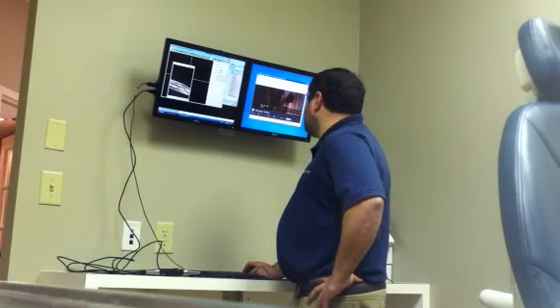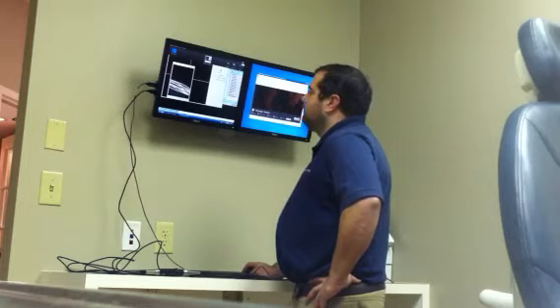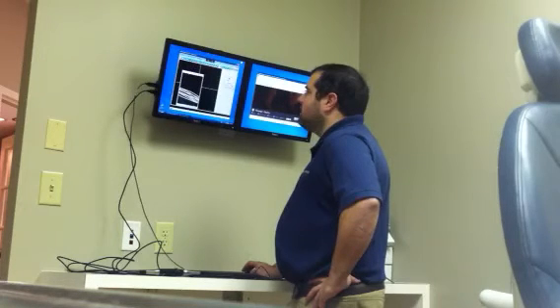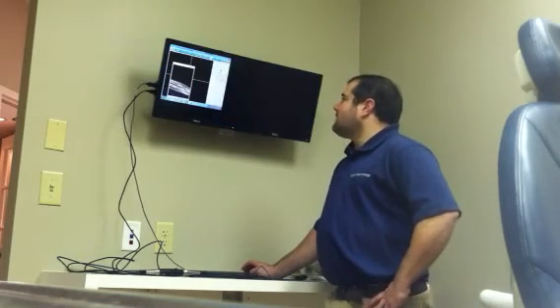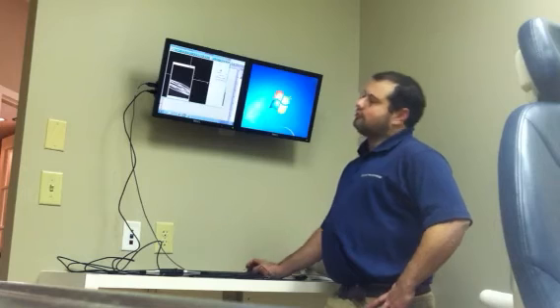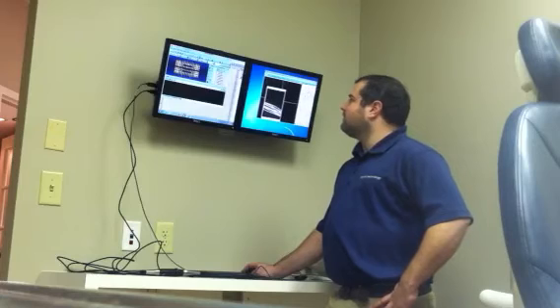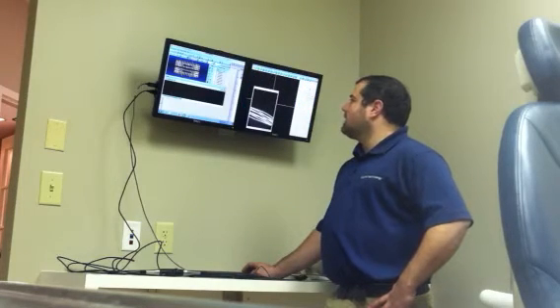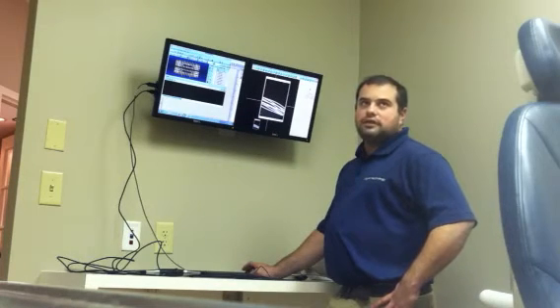I can go ahead and actually pause my Hulu content now, and at the same time we will take our VDI in a box and make VDI in a box take over both displays. We're just going to drag it into the middle and then maximize it again. Now our virtual desktop is covering both displays, and we could actually move Dexis to our secondary display and pull up our image full screen there for the patient.